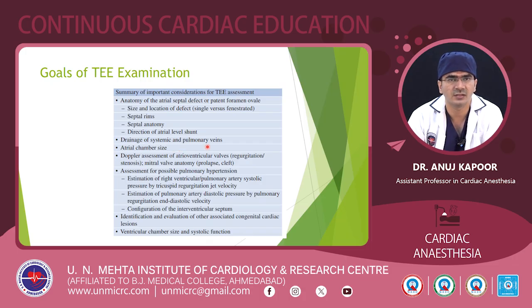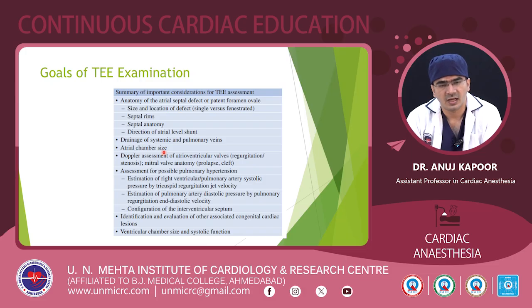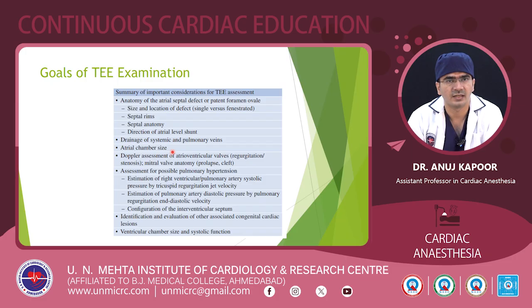So we will have to ascertain that all the pulmonary veins are draining into the LA. We will also have to assess the atrial chamber size. A large RA or dilated RA-RV indicates that there are chances of development of PH or RV failure.